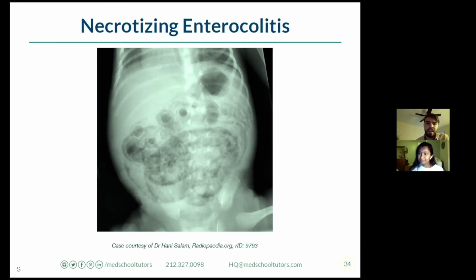Absolutely. And again, I think the biggest thing here for a non-radiologist is that I'm going to recognize that I think this preterm baby has abdominal pain consistent with necrotizing enterocolitis, and then I'm going to go back to the image and see this. I probably will honestly not see this the first time, and that's okay. So don't spend precious time looking at an image that you may figure out after looking at the vignette. Absolutely. Awesome. Thank you.